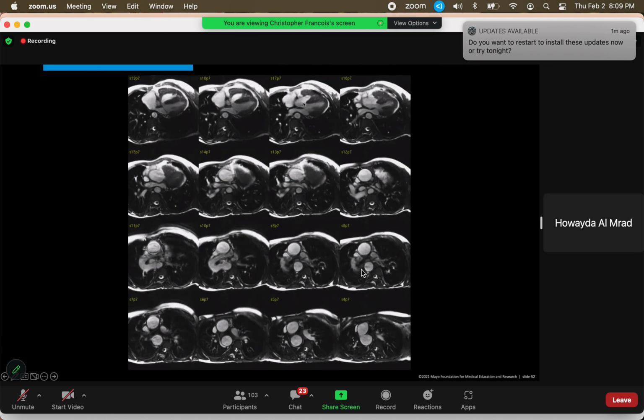And then I see overriding of the aorta. Yes. And I see it mainly in the third row, if I'm not mistaken. And I'm searching for a pulmonary stenosis, but I didn't find it yet.